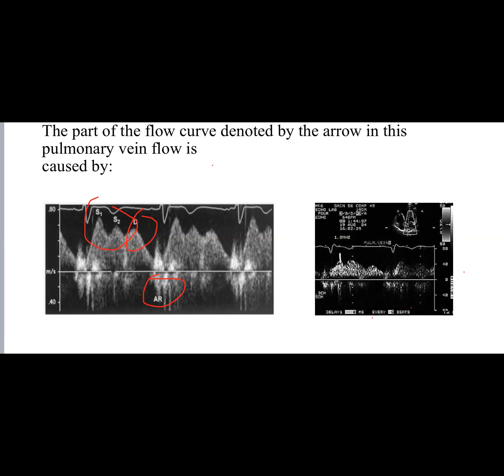So from all the hepatic and pulmonary venous Doppler, the most important one for diastolic function analysis is the AR in terms of duration and velocity. So the more broad it is and the more deep it is, meaning more blood going backward, meaning more stiffness downward, it means more diastolic dysfunction. Okay? You get that? Yes. Okay. Good. Very good.